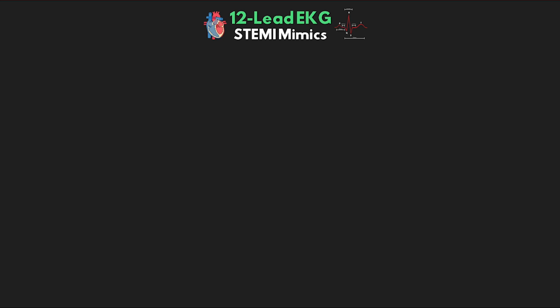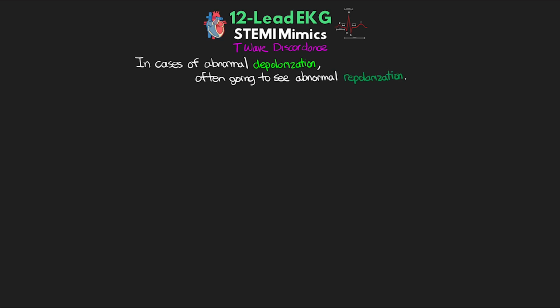Alright, so before moving on and talking about the next few pathologies, it's really helpful to have an understanding of a concept that we call the rule of appropriate T-wave discordance. So you're probably thinking, what the heck is he talking about? So in cases where we have abnormal depolarization, we're often going to see abnormal repolarization. So what this means is that we'd expect to see the T wave going in the opposite direction of the predominant either R wave or S wave. So if our predominant wave is positive, we'd expect to see a negative T wave and vice versa.